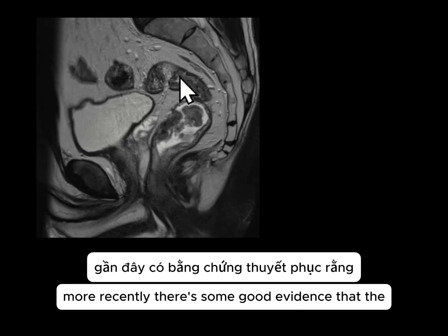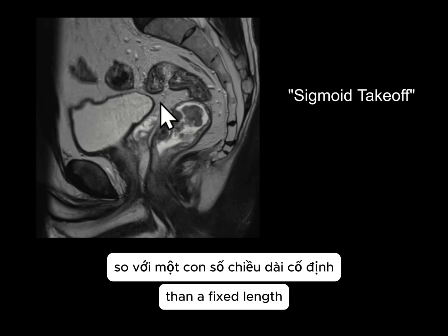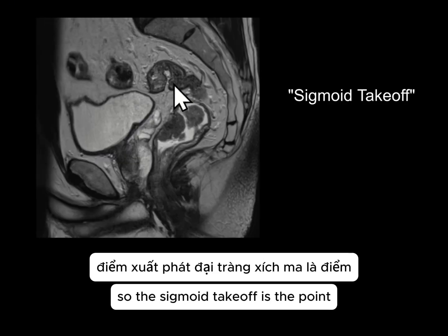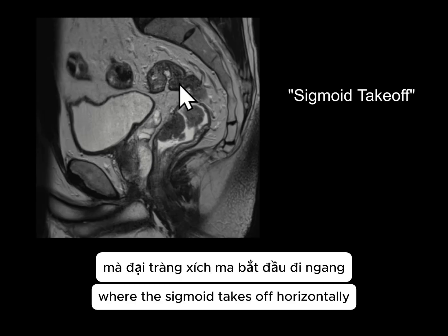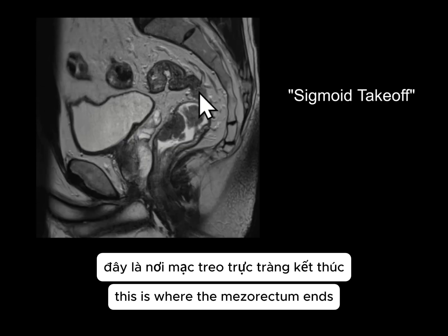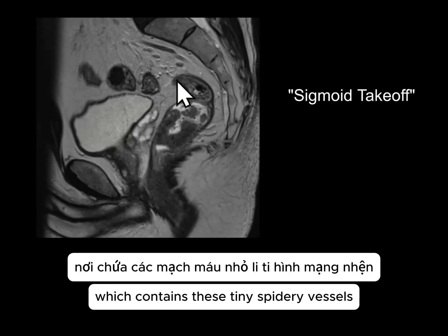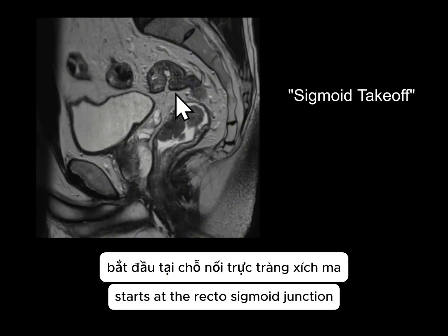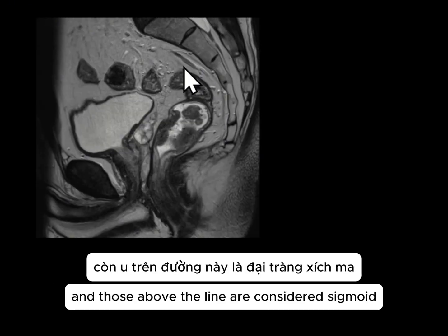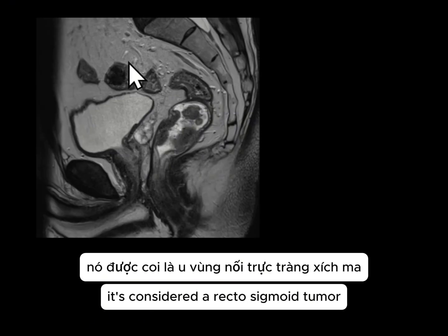More recently, there's some good evidence that the sigmoid takeoff is a better marker of the upper boundary of the rectum than a fixed length and can be reliably identified on MRI. So the sigmoid takeoff is the point where the sigmoid takes off horizontally and sweeps away from the sacrum. This is where the mesorectum ends and the sigmoid mesocolon, which contains these tiny spidery vessels, starts at the recto-sigmoid junction, so here. So tumors below this line are considered upper rectal, and those above the line are considered sigmoid. And if the tumor straddles this point, it's considered a rectosigmoid tumor.